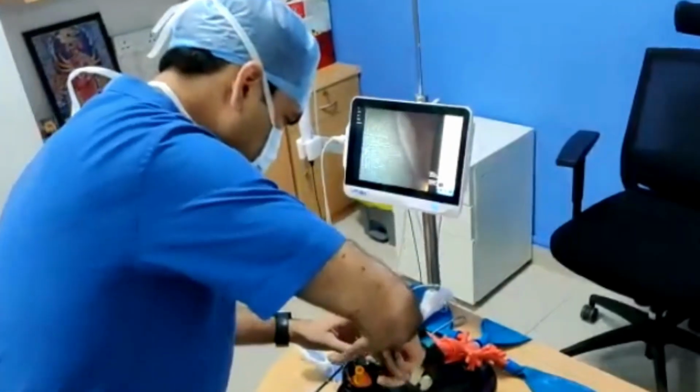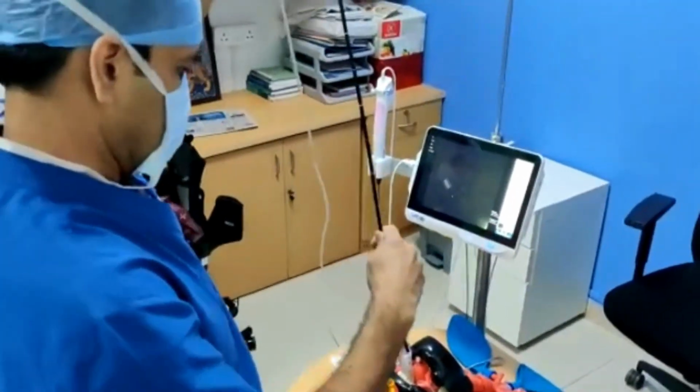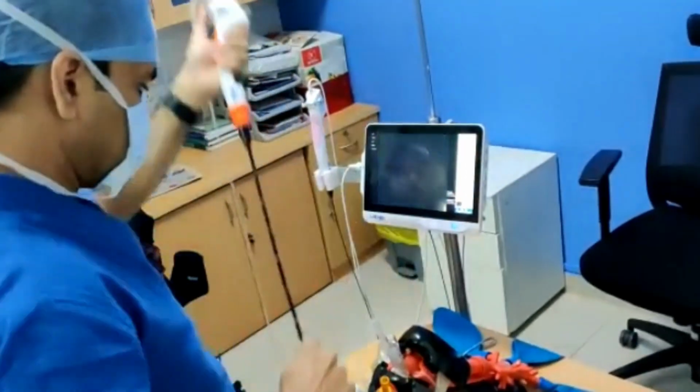Today I would like to discuss airway management. When it comes to airway management, it's a life and death situation for anesthesiologists. Everybody knows that you have to be a master in this. There are no excuses. So usually you have plan A, plan B and plan C.